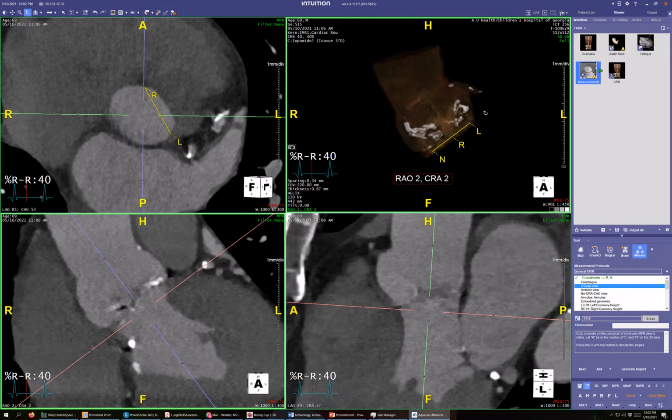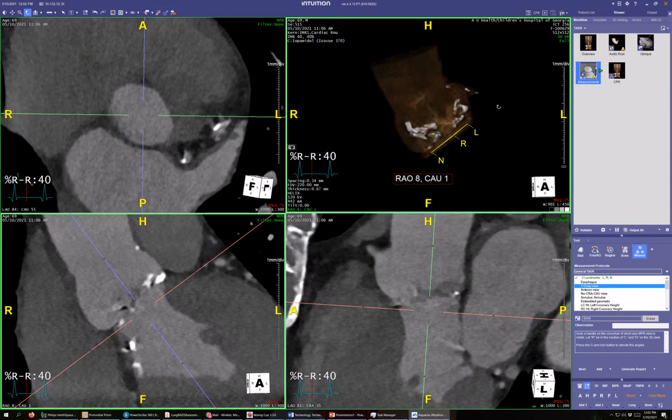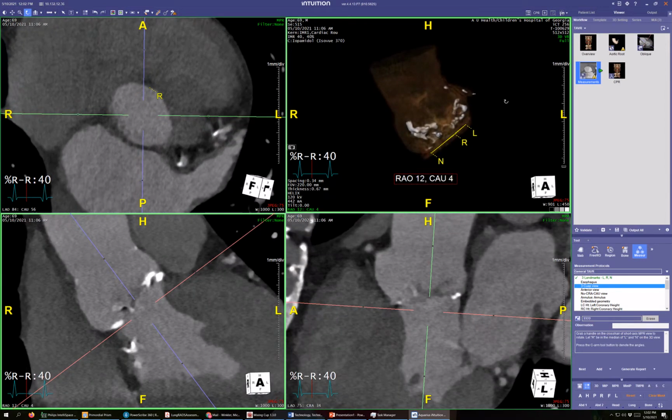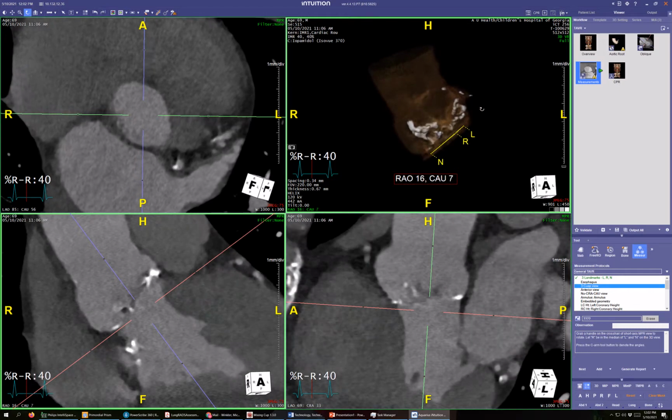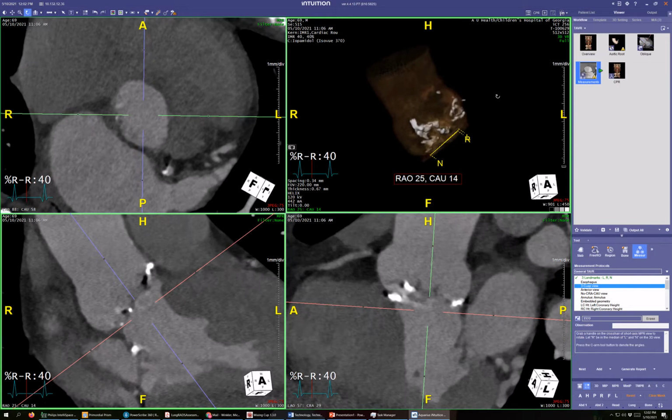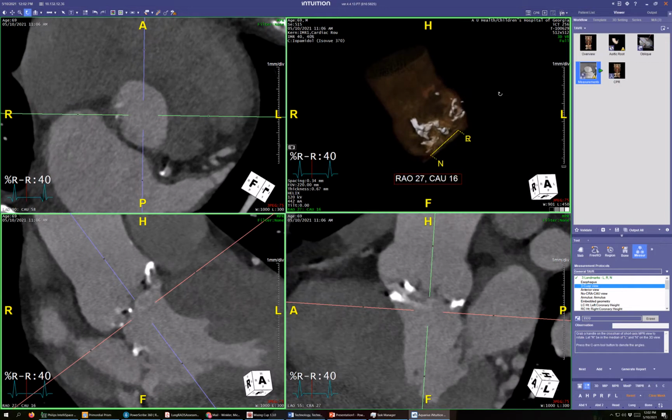So I'm just going to rotate. If we were looking from below, I'm rotating clockwise. And I'm going to just position the right hinge point over the left.